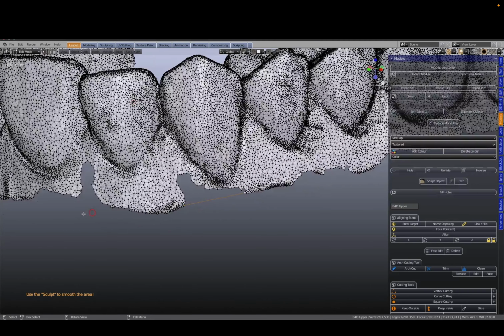In order to even the mesh, you can use the dropper function after activating the sculpt mode. With the dropper, you can mimic the mesh of a particular area when sculpting. This time, drag the dropper to an area of the mesh you would like to mimic, then left-click to select that particular area. Again, brush over the defect. When done, exit the Sculpt tool. In edit mode, notice how the structure of the mesh has changed to mimic the surrounding area.